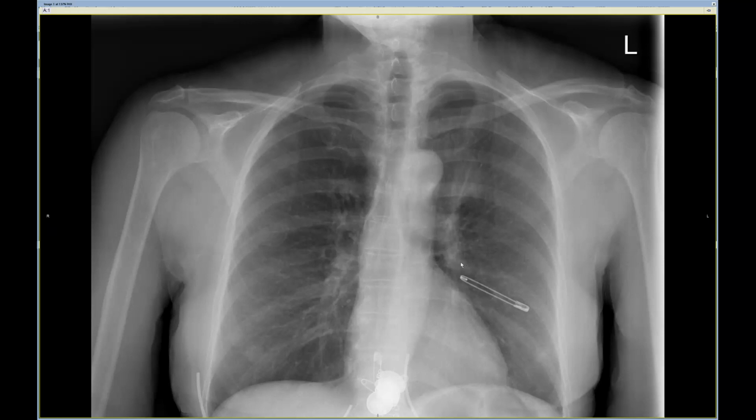The hilum is a bit bulkier, a bit easier to see, and it looks like there's a veil over the region above the hilum, and this veil isn't obscuring the arch, so it's probably not an anterior mediastinal mass. It's probably a posterior mediastinal mass, or a paravertebral mass, or it could be in the lungs as well. The ribs don't look eroded.